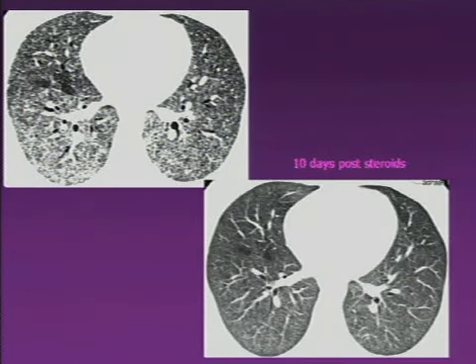This is the same patient. The image in the lower right is this patient 10 days after steroid therapy. This person got a very nice response to steroids from his lupus pneumonitis.